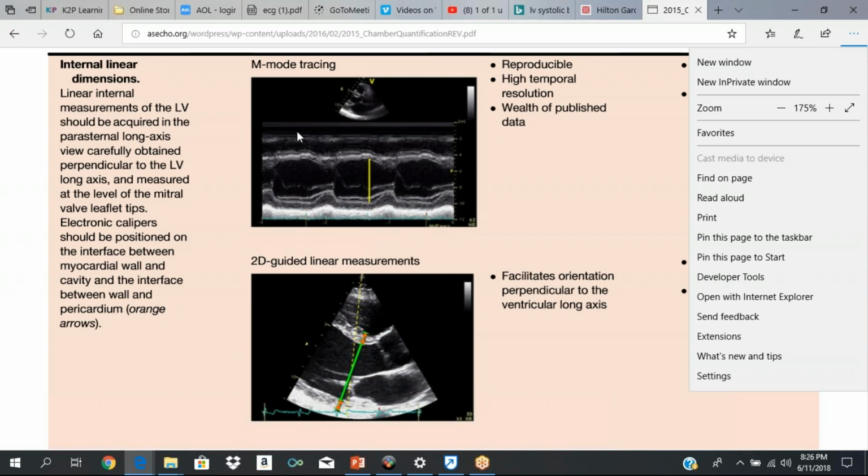So the first thing you encounter is the chest wall. The chest wall includes, you know, your skin, subcutaneous tissue, fat, all that sort of stuff. Then you'll get to the pericardium. Then you get to the RV wall. Then the RV cavity is there. This is your septum, and the septum in diastole moves away from the posterior wall.